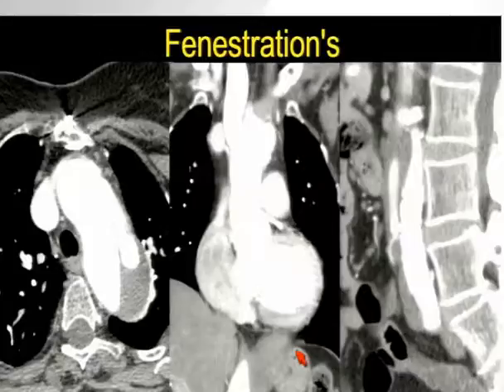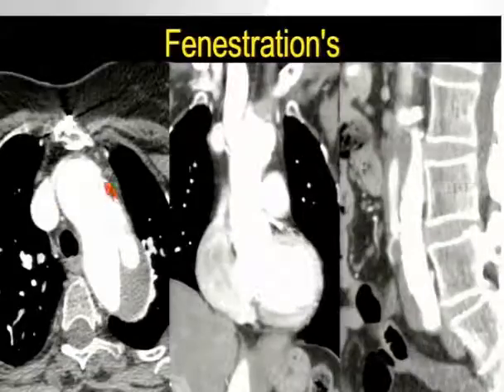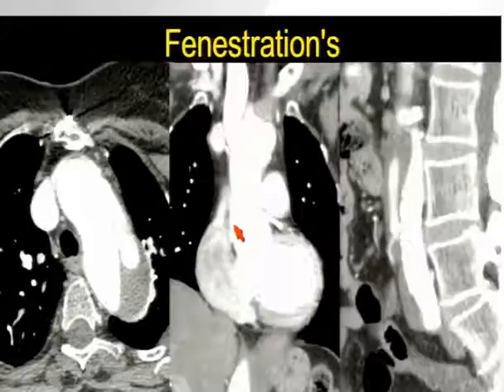So just a couple of examples of what we talk about. You can have a look here on the first image on your left. It doesn't really project well up there because that looks like that's enhanced. On my screen here, that's not enhanced to SVC. And you can see a small fenestration of a slow-flowing dissection. If you look in the coronal plane, you see that the level of the right atrium is actually completely washed out and you have good opacification within the ascending aorta.